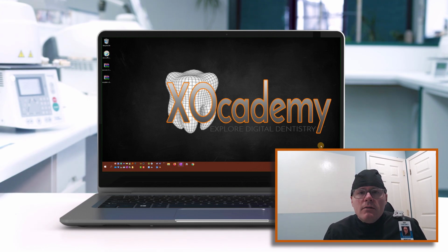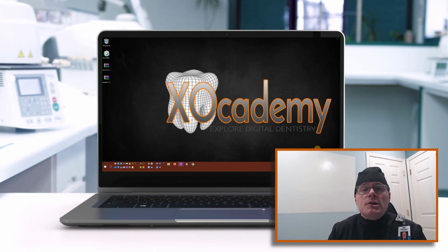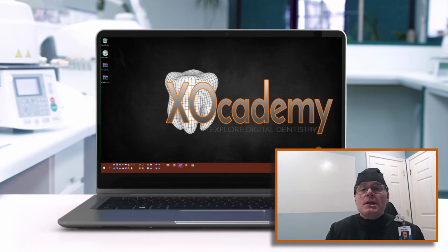new Galway version 3.0 DentalCAD release, and Exoplan version 3.0 is also released. And this video is going to go over some installation considerations, whether you are installing exocad for the first time or you're upgrading from a previous version. There are some things to consider when you install the program. It's not something that you just want to unzip and get going. You want to do some setup and some configuration before you get started.